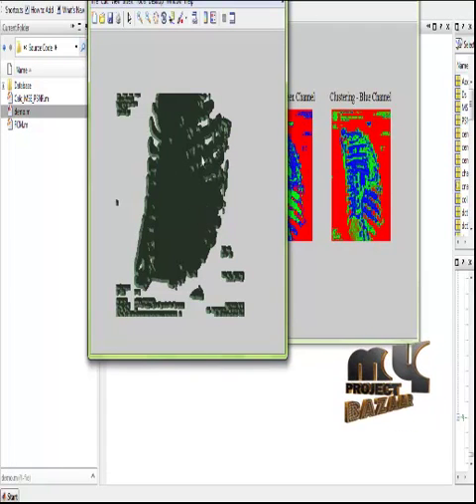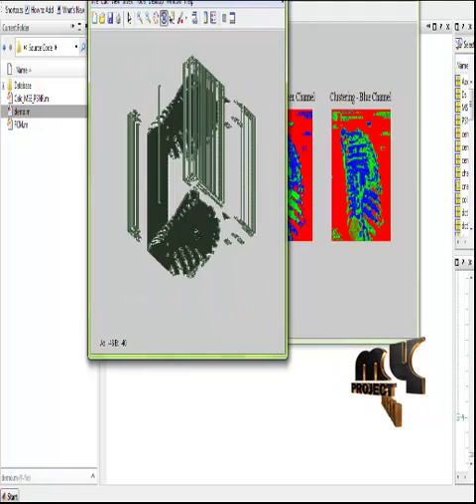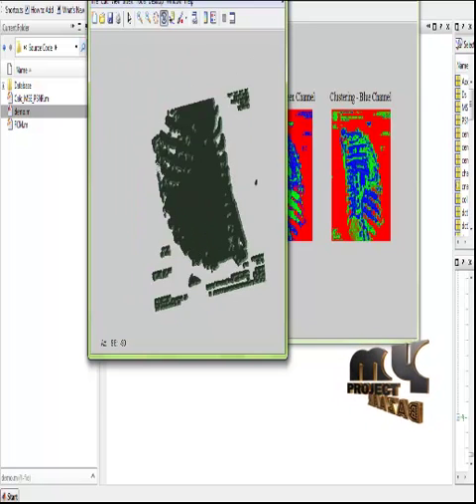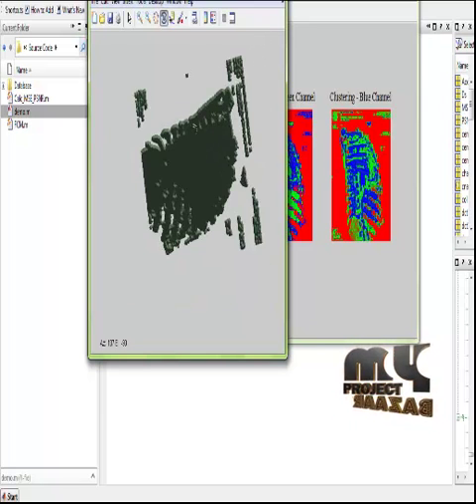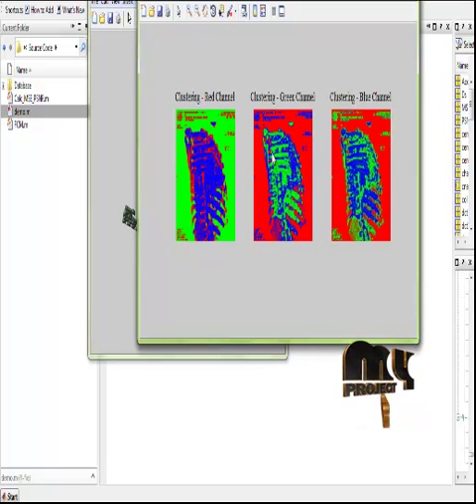These detected regions are helpful in viewing the 3D locations of the images. Thus we have segmented the objects in the images, and we have displayed them in 3D viewing based on the clustering employed using kernel based fuzzy C-means. This process is applied for color images. For any type of color images, this process can be employed.